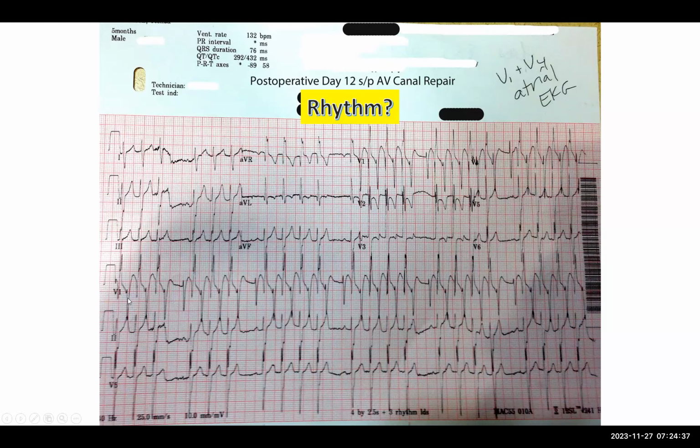And you always have to remember, when you're recording an electrogram directly from the heart, the impulse on the paper or on the monitor may look very large, even larger than the QRS, because you're recording directly from the myocardium. Normally, of course, the P wave is tiny relative to the size of the QRS, but because we're recording directly from the atrium, we have a large atrial electrogram.